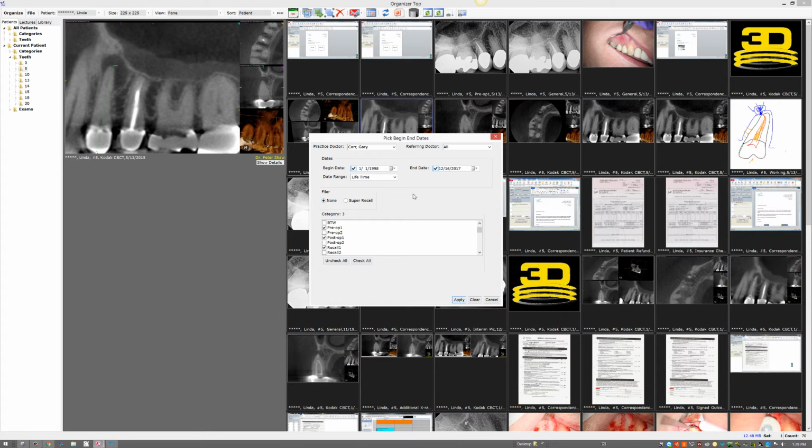So let's demonstrate here a little bit. Just to limit the query so you're not overwhelmed with images, let me just pick one referring doctor. Let's pick Dr. Shaw, who's a good referring doctor of mine. Let's select a date range.